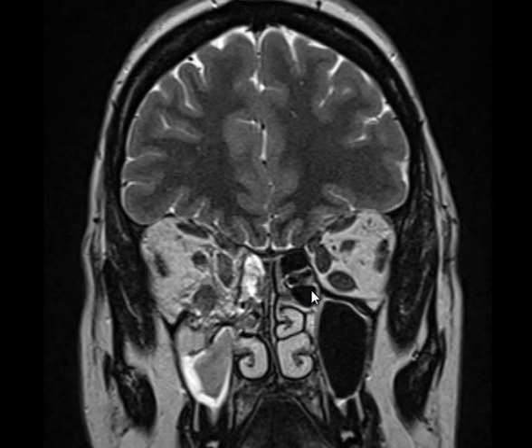Here there is something. If I write it, she will go into surgery immediately. Ethmoid air sinuses are opacified too. What's the emergency about that? We see ethmoid opacification every day. The most important thing is to mention the relationship of the inferior rectus and the medial rectus to the sinus.